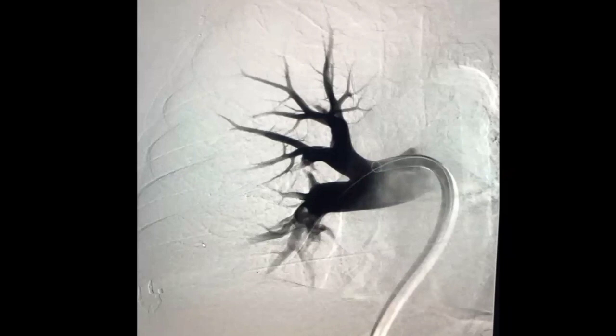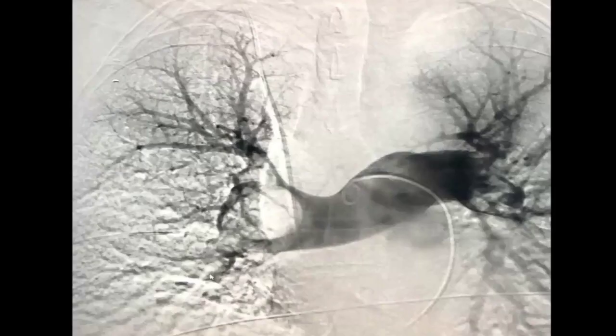Once we establish this is a pulmonary arterial angiogram, yes, they're also done in other conditions, such as if we're embolizing a ruptured pulmonary aneurysm, or a pulmonary AV malformation in conditions such as HHT or Osler-Weber-Rendu syndrome. But what I wanted to get at is this is the pulmonary artery angiogram. This is a normal configuration of the pulmonary artery. You can say it is a bit enlarged, but what I want you to pick out is a filling defect, which you did very well. And then I drew your attention to this oligemia.